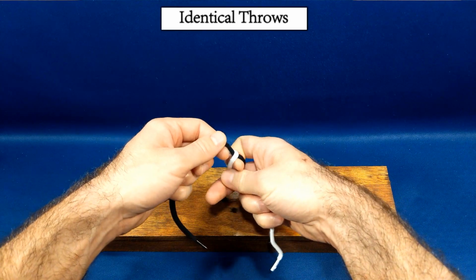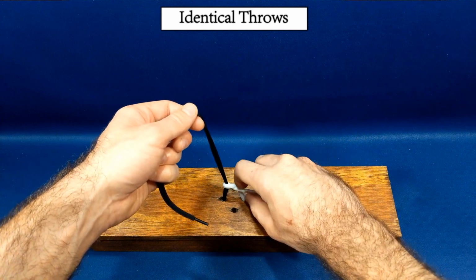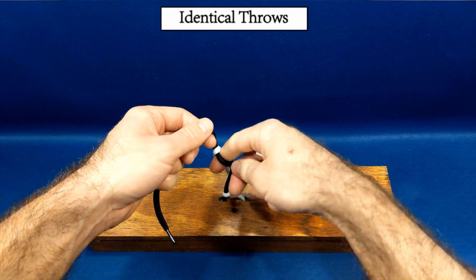Shown here is the performance of two identical throws. An overhand throw is performed and tightened, and then a second overhand throw is performed and tightened. These two throws are identical.